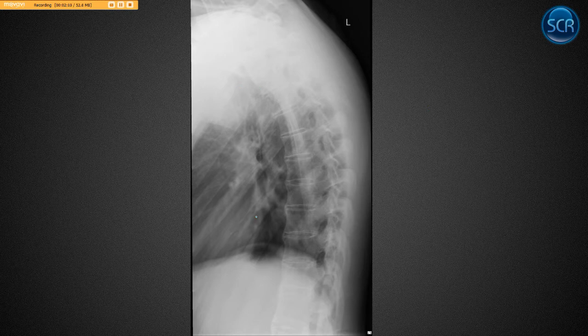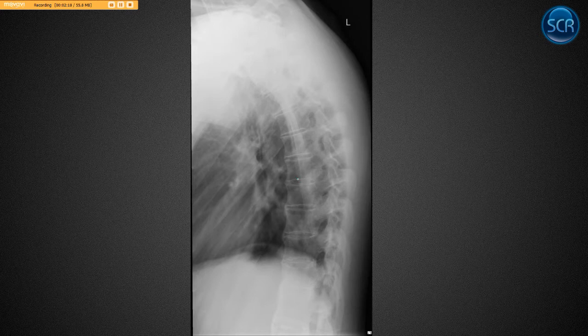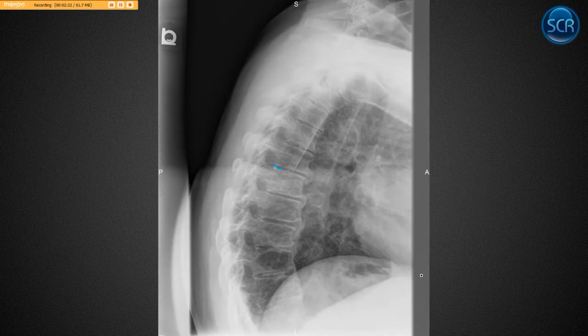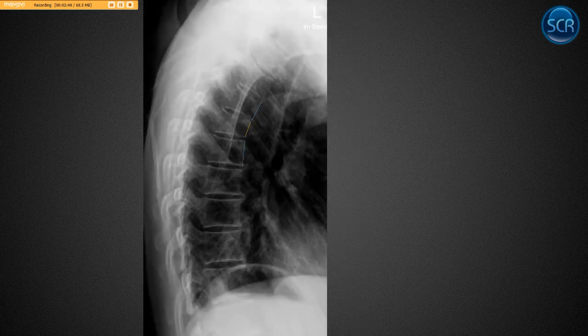So on this case, this isn't DISH. So in the last case, you saw what it would look like. Sometimes it's not quite this impressive like we saw in the prior case, but in this one, this is marginal syndesmophyte formation. So this patient has AS, and you can see it, it's kind of hard to tell posteriorly. Up here, this one's definitely bridged. But in the normal lateral thoracic spine, if we just look at this one, there are these little bumps, and so it is sometimes hard to tell posteriorly if it's fused, because you could argue that one looks fused, but that's just normal. But in this case, they do have posterior fusion, marginal syndesmophyte formation anteriorly, especially down here. So this is a case of AS.